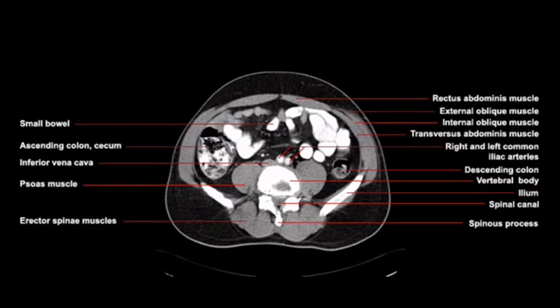One more slice that we'll look at, which again shows us some of the same information, but some new information. Notice how we go lower in the abdomen. The anterior portion of the abdomen becomes almost filled with small bowel. Something else that we can see that's very important here is we now actually see 3 round structures on the anterior side of the spine, and that's because the descending abdominal aorta has now bifurcated into the right and the left common iliac arteries. The inferior vena cava also is the result of a convergence of 2 vessels, but we cannot yet see that separation.